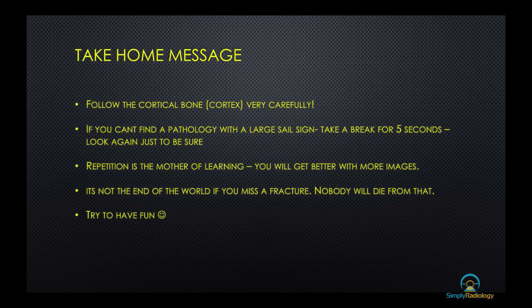And my final big message to all of you guys is to, again, follow the cortical bone very carefully. I can't stress this enough. Personally, I have found so many stuff just by following this stuff. Because when you look at something quickly, for something obvious, you're gonna miss it 50% of the time, I promise you.